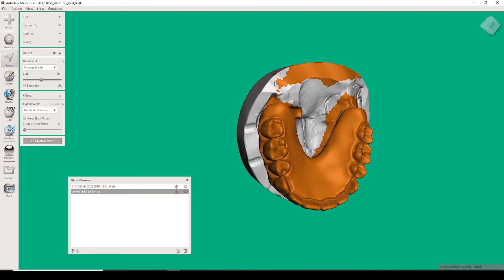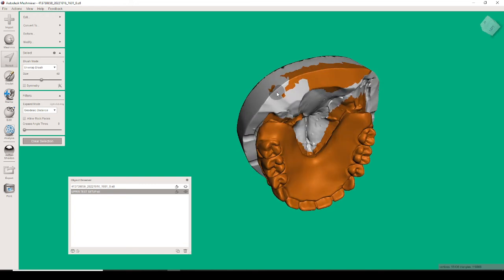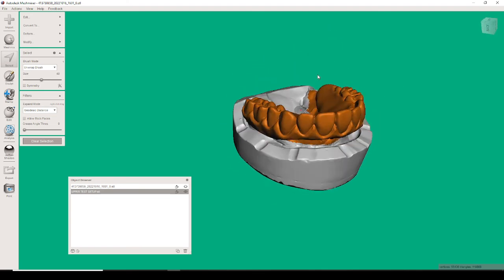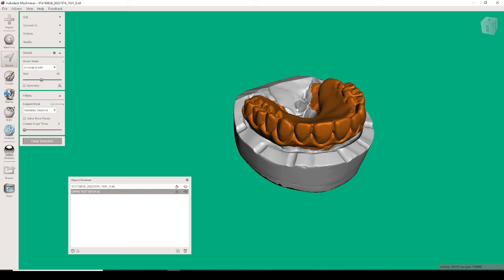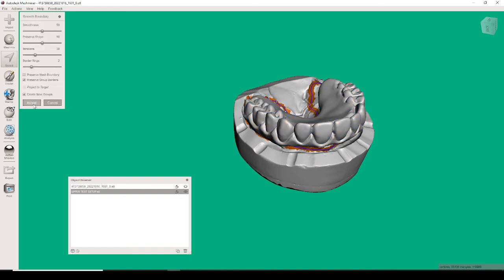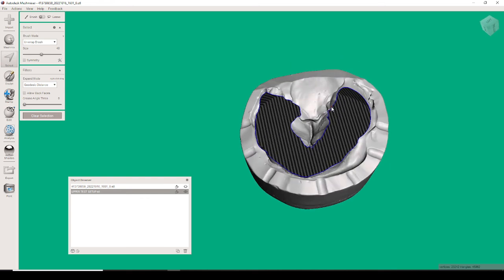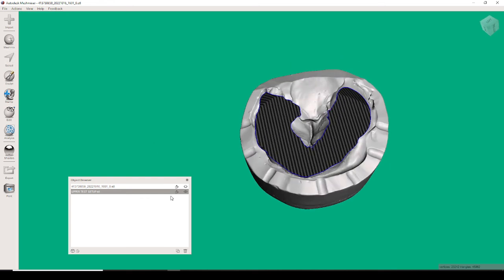So I'm going to erase this. I'm pressing the shift button and I'm clicking on the mouth for selection, and it actually just unselects things when I do this. I'm just trying to be extra cautious here to make sure it works. All right, I also press O and B to make a selection a little bit more uniform. And then I just delete it and I clear selection.